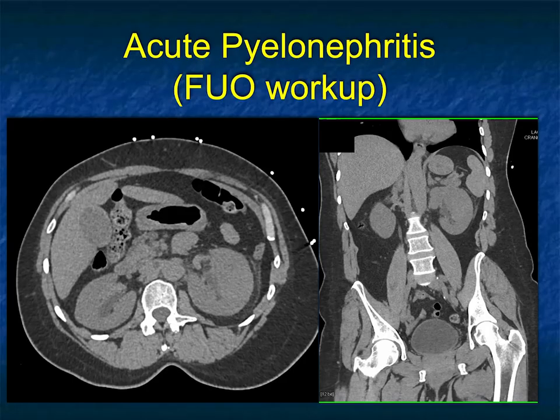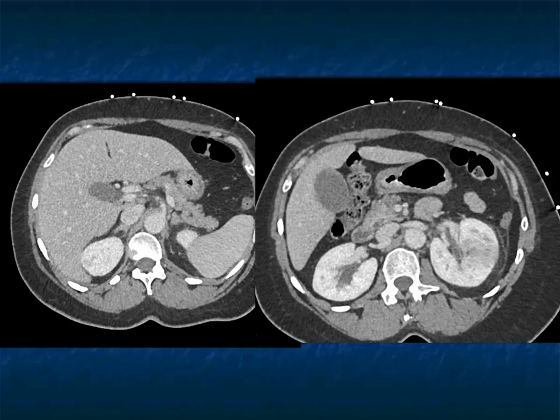Now, I mentioned non-contrast. Sometimes you can make the diagnosis. Here, both kidneys look like they're stranding, but especially the left kidney. The left kidney's larger. That's going to be pyelonephritis. I guess I could say there's a tumor present, and we definitely know there's pathology in the left kidney, but I would go with pyelo most likely.